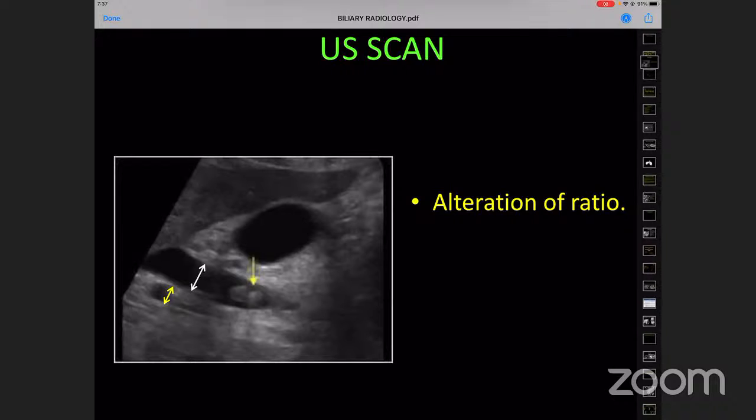And if it is an edematous pancreas, then we could definitely see a bulky, edematous pancreas which is hypoechoic, which is compressing the pancreatic duct. The peripancreatic fat would be more echogenic, and induration will be there. So all these features go in favor of acute pancreatitis, even if there is no peripancreatic collection. Seeing a hypoechoic pancreas, not being able to see the pancreatic duct properly, and more echogenic and nodular peripancreatic fat, those things go in favor of acute pancreatitis.